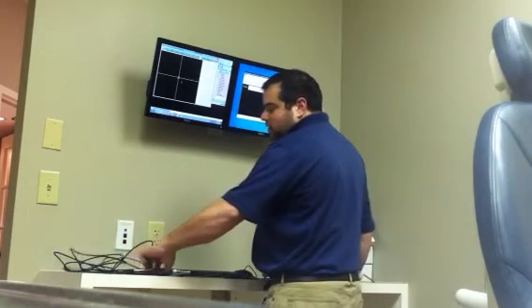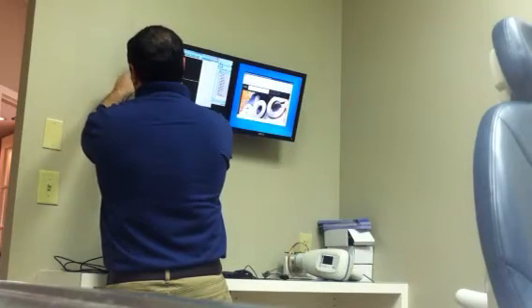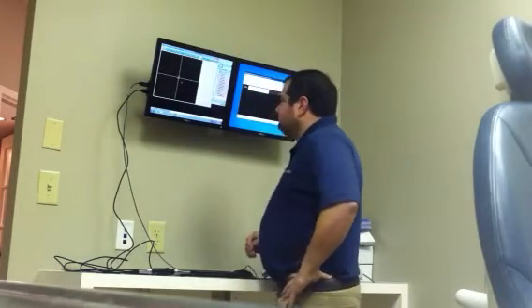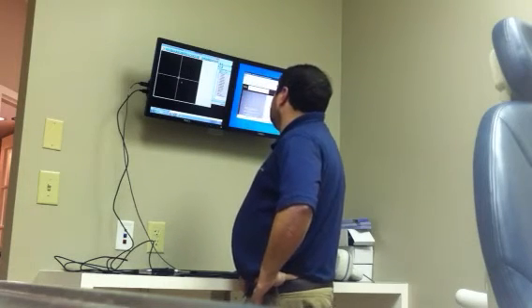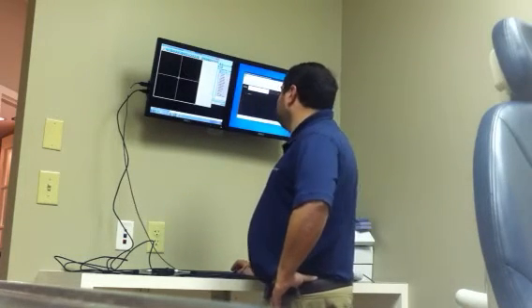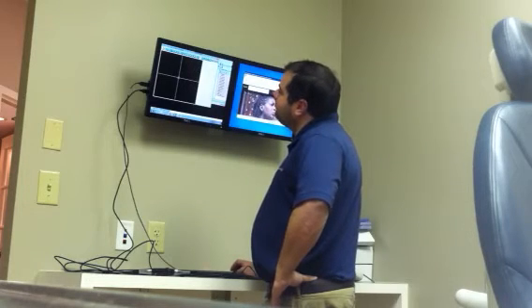At this point, I'm going to plug in an intraoral camera, which is a Digidoc, and a Dexis Platinum x-ray sensor. Those USB devices, you can now hear, have just been detected, and our Hulu video is beginning to play here on the secondary display. Or some kind of advertisement is playing on the second display.